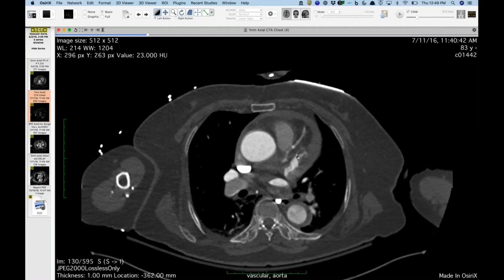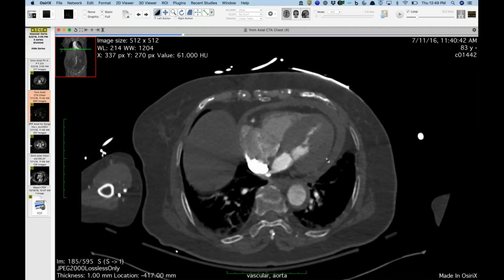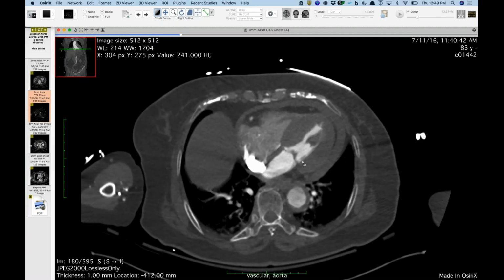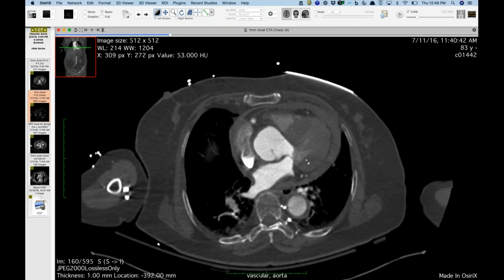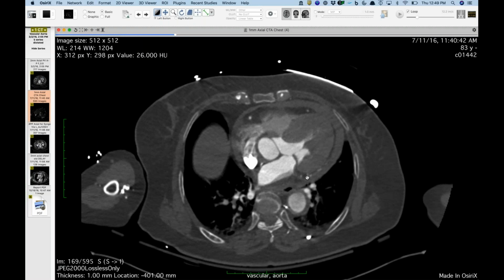Do you think there's left ventricular hypertrophy here, by the way? Yeah, I think there probably is. It looks like we're during systole though, because the mitral valve is closed. But certainly, I bet she has longstanding hypertension. So yeah, I think that's probably true.